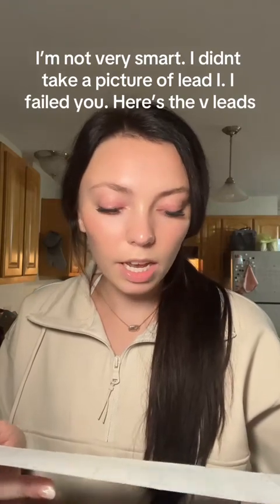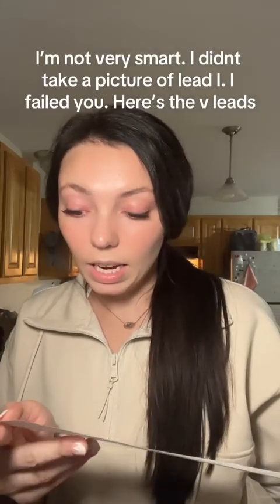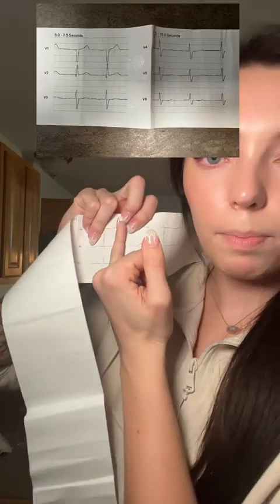All right, next, my most important question, do I have P waves? This one is actually really hard to see because you can't really tell if that's the baseline or if that's the P wave. So that means I'm gonna go over here. I'm gonna flash a couple more pictures on the screen right here of your V leads, and I can march out P waves in some of these leads. Like in lead 1, I do see a very distinct P wave in some of them. But the way that I do this is if I can't march out my P waves all the way down, then I don't consider it a P wave. As my teacher would always tell me, don't make up P waves. So I am actually going to say no, this does not have P waves.